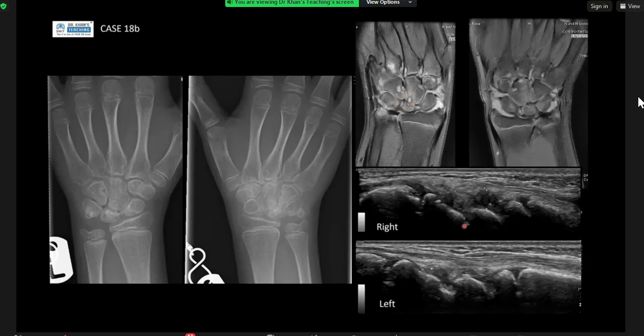Now, on ultrasound, this is your classic view of your wrist joint, the radiocarpal joint in the midline of your wrist, and the black bit shows synovial thickening. The only bit that I didn't give you was the Doppler, which would show vascularity, suggesting it's active synovitis. In arthritis in a child, if you just had treatment, you can have a lack of Doppler vascularity, but you still have synovial thickening persisting for a bit until the treatment starts to kick in. But you can notice that on the right side it is a lot worse than the left, which corresponds with the patient's symptoms.